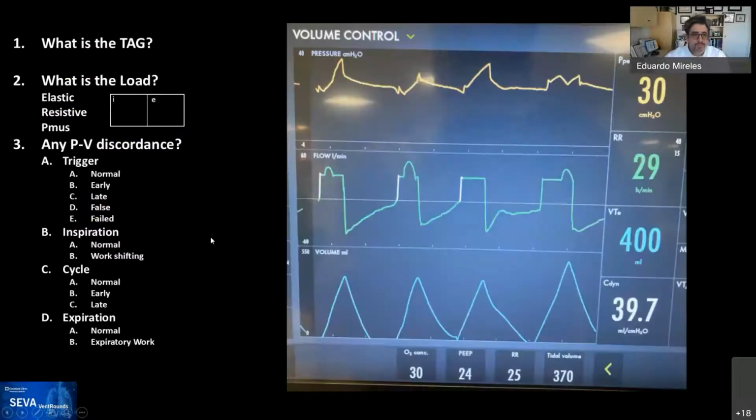Very good. So let's start with this one. I posted this one on Twitter because I thought that was fantastic. Actually, it was near the end of the day. I was walking around the unit, and I saw this patient, and I thought that it was a fantastic image. I mean, this was by pure luck. Obviously, you don't expect the patient to do every single interaction possible in each one of the 4 breaths that the patient had.